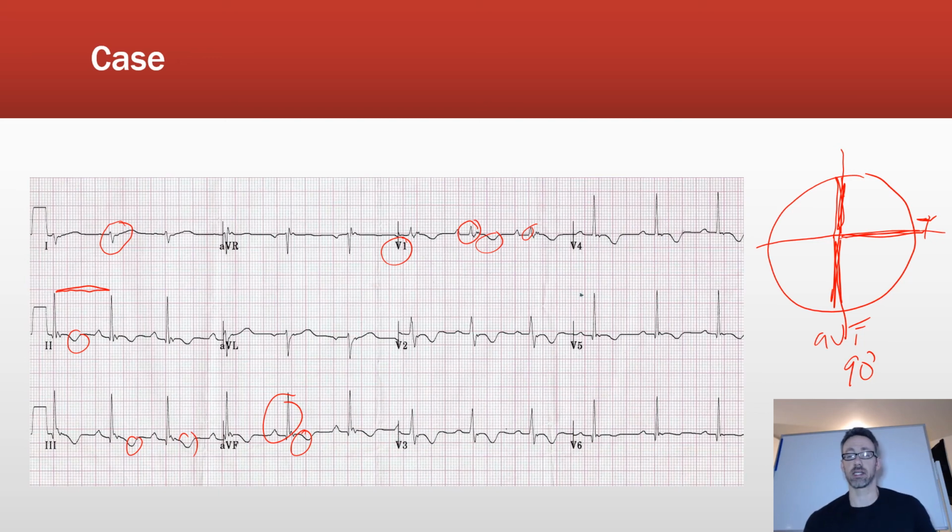You can see that in right ventricular hypertrophy in cases of chronic pulmonary diseases. You might see the strain pattern in something like a PE, which would be happening acutely, although actually in a pulmonary embolism, tachycardia is typically the most common finding, which is not seen here. So there are multiple reasons which we'd have to look into in the context of this. But what you see is right axis deviation, which led us to seeing this right ventricular hypertrophy type pattern.